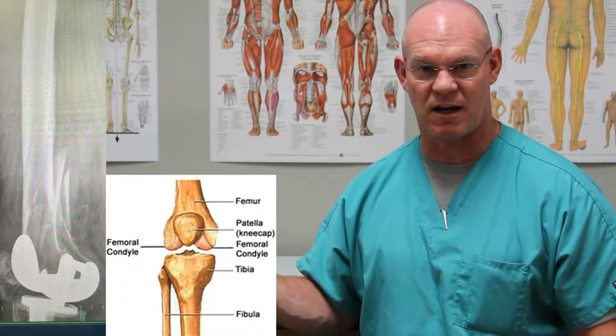Okay. So these last two x-rays are a periprosthetic, which in medical terms means that it's around a prosthesis. So on the x-ray you can see that the patient's already had a total knee placed. So that makes it somewhat difficult. We've talked about these on episodes before about how if there's a prosthesis in there, it makes fixing the fracture more difficult because of the metal from the prosthesis and the limitations in regards to how we can put hardware in there.